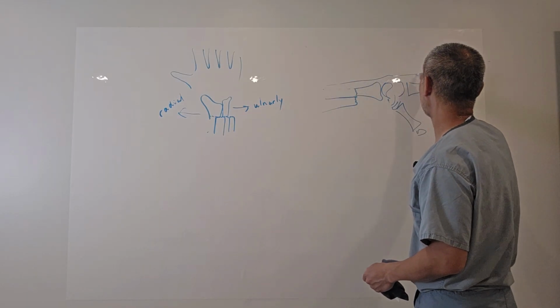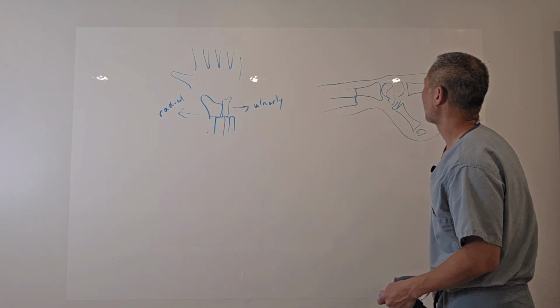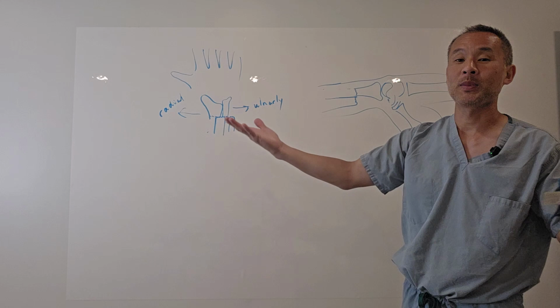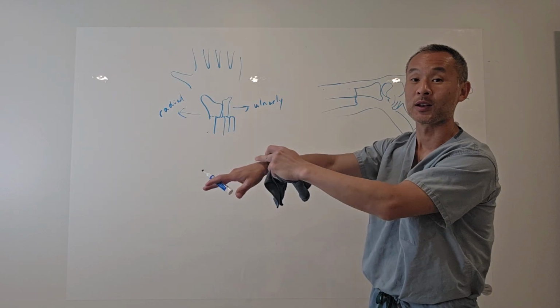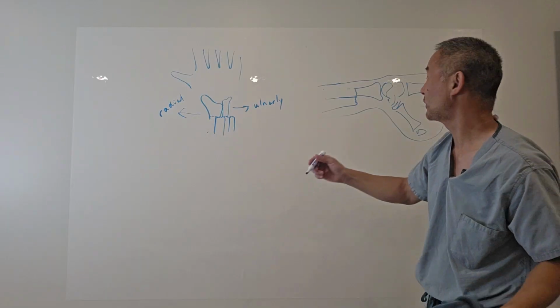So this is a hand, that's the thumb. Now, which way is anterior and which way is posterior? It can also be very confusing. So just to eliminate that, if it displaces, or we're referring to the dorsum of the hand or the back of the hand, we're going to call that dorsal.